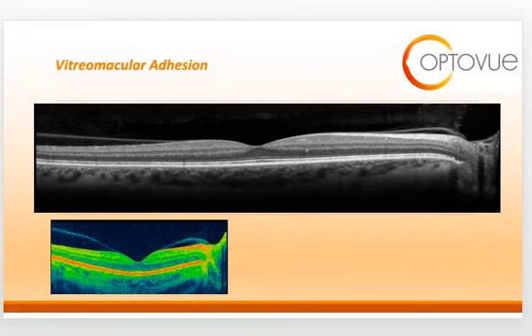So you can see here that surfacing on the border of the ILM, extending into the vitreous, are these two gray lines. Those are the vitreous bodies, or the posterior hyaloid, still attached surrounding the macula. You can see also on the right-hand side the bend, which indicates the optic nerve head, and you can see that the vitreous is still attached at the optic nerve head.